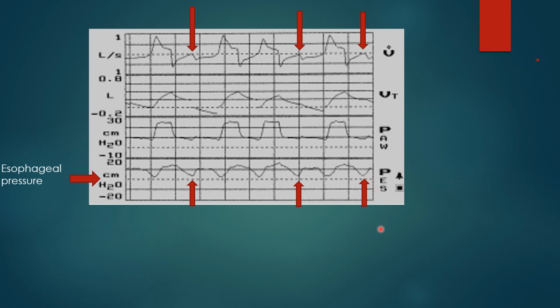Another problem with this is that the ventilator is going to report a respiratory rate based on the breaths that were triggered. So the ventilator would say that this guy's respiratory rate is 24 breaths per minute. But since it's not counting this one and this one and this one, this patient's actually making 42 inspiratory efforts a minute. But it's not going to be recognized by you if you're not looking at the waveforms, and know that when it looks like the patient exhaled twice, that is usually because of a missed trigger, and the missed trigger can be caused by auto-PEEP.